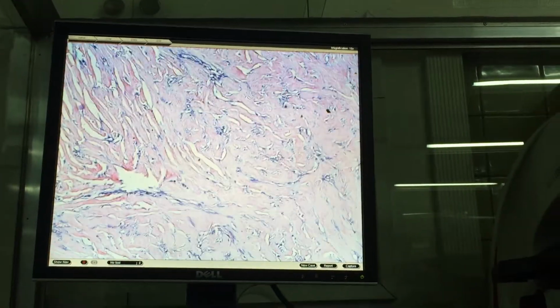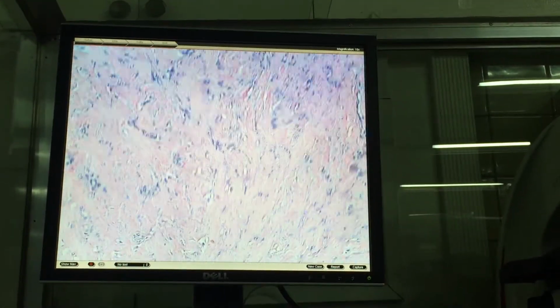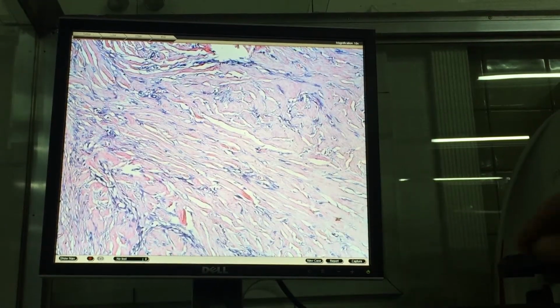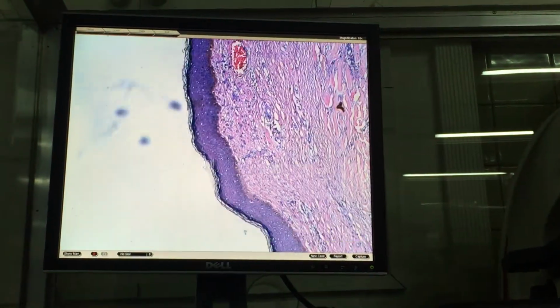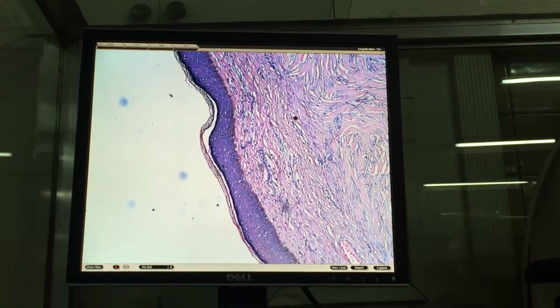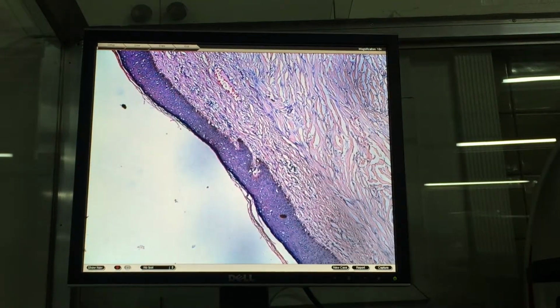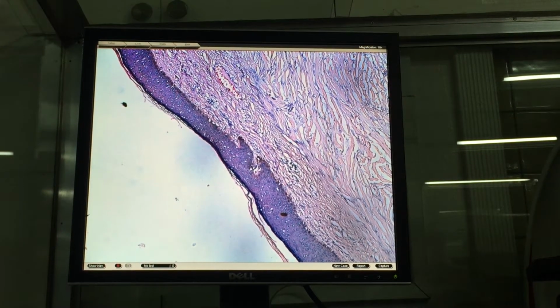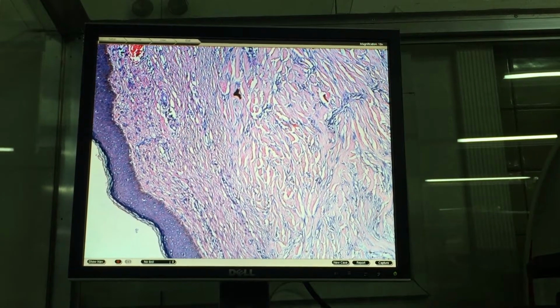Diagnosis. You've forgotten, you discussed this skin. Okay, keloid. This is your keloid. Very important, the overlying stratified squamous epithelium is thin, and as you can see, there's no accompanying adnexal tissue. There's no sebaceous gland, there's no hair follicle. So this is your keloid.